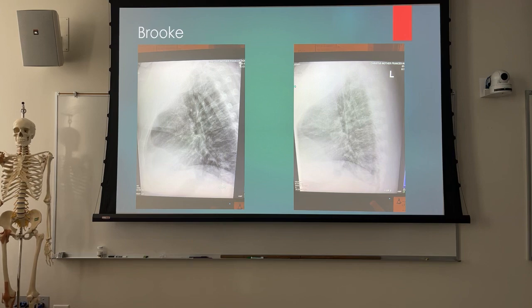You did the right thing in going back and making a second image to include the anterior portion of the lung. And you also did the right thing in, if you've got a patient like this that you just know that you can't fit on the image receptor, you could go back and you could probably position this guy perfectly 15, 20 times. You're just not going to put him on an image receptor, right? So what's the point? Go back and get what you didn't get before, instead of trying to make something happen that's not going to happen.